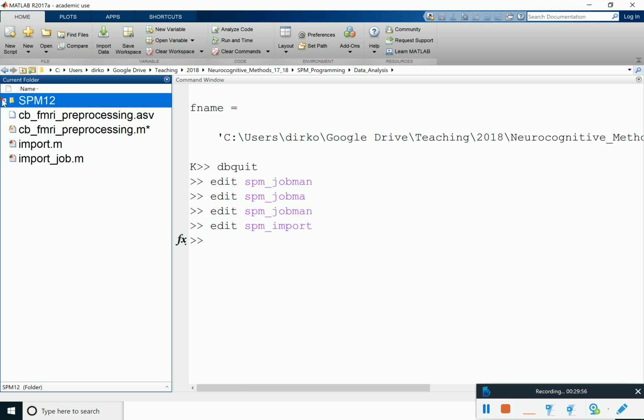Yeah, so we are creating only one Nifty file, right? Because there's also the option to create the header separately. What I want to do is actually create this one Nifty file, which is a 4D file, and then separate this into 400 Nifty volumes. And I'm not sure whether you refer to the image header format. We are not there yet, but we're not using the image header format, but the Nifty format.